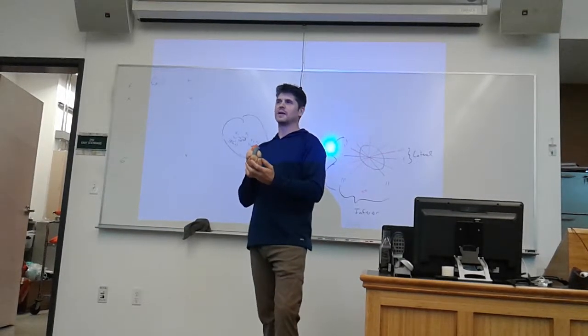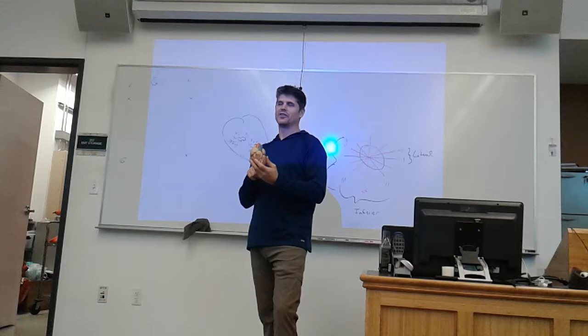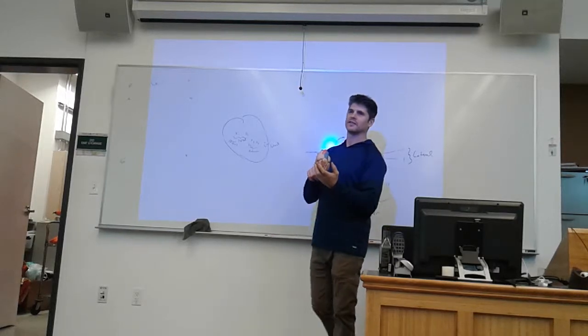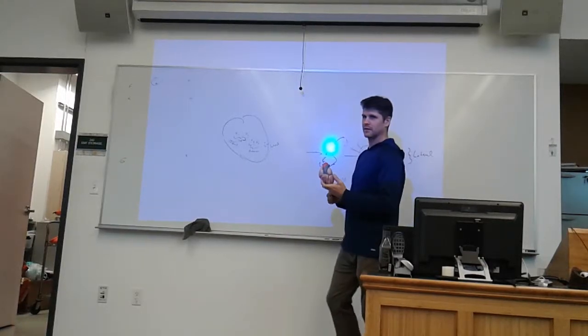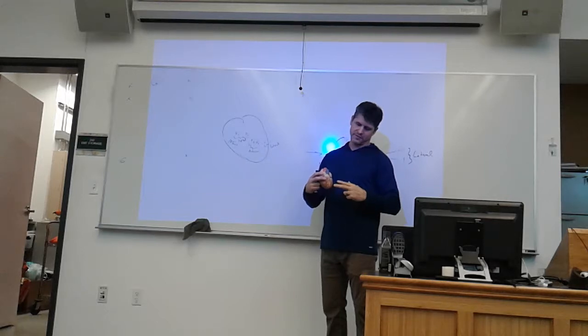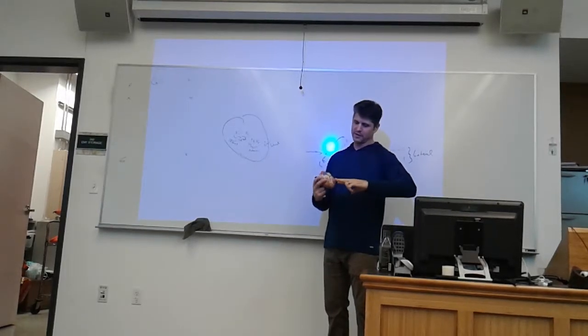Any ideas? Eventually we can just name them all. Yeah, all of them, and then one of them has to be right. aVL and lead 1. No ideas with clear distinction of why they might show the best? Would they show reciprocal changes? I was thinking reciprocal changes in V3 and V4. So down here is showing you reciprocal changes to the back.